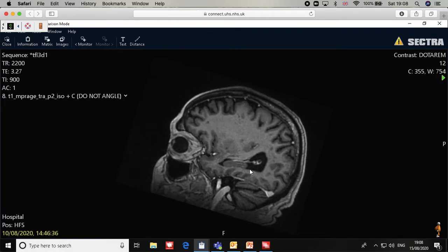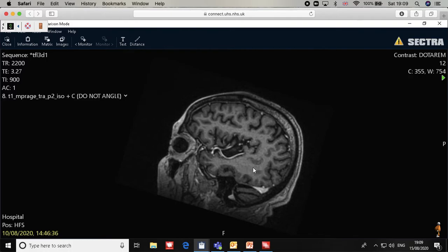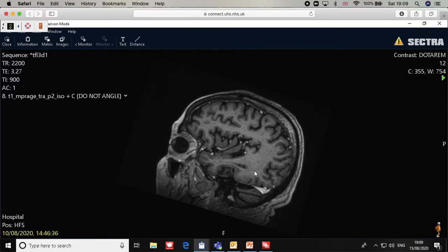If you look at the floor of the temporal horn of the lateral ventricle, you will see this gray matter here. This is the hippocampus. So the best view to see your hippocampus is just the floor of the lateral ventricle. You have to familiarize yourself with this. Go to the lateral ventricle, the temporal horn, and then look at the gray matter in the floor.